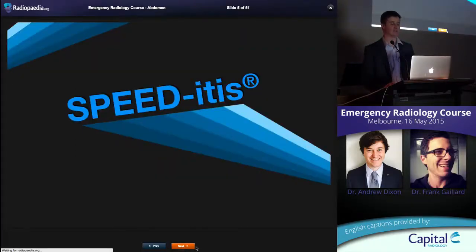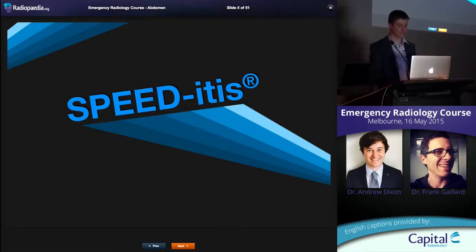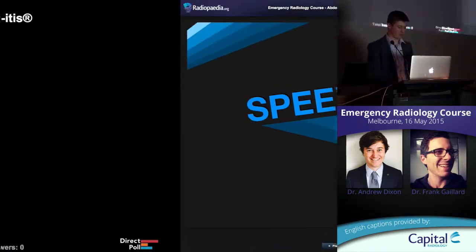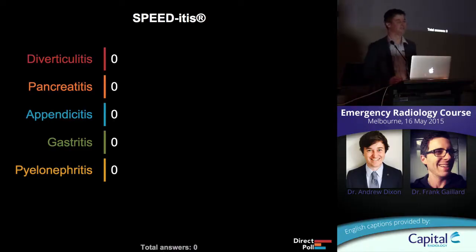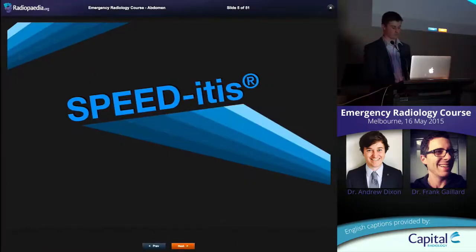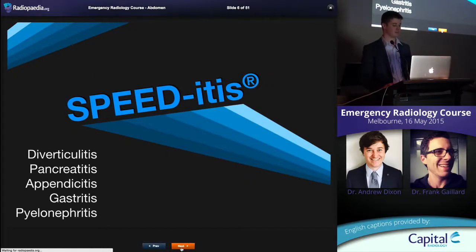And we're going to play a game called Speeditis. It's a registered trademark. It's new, so it's another poll. So if you can have a look at your poll options. The poll options are diverticulitis, pancreatitis, appendicitis, gastritis, and pyelonephritis. We're in the itis section of the talk. And this is actually a game I sometimes play with my registrars because you can spot where the abnormality is relatively quickly if you know what to look for. So let's have a go. You ready? It's going to be pretty quick. They're the options.